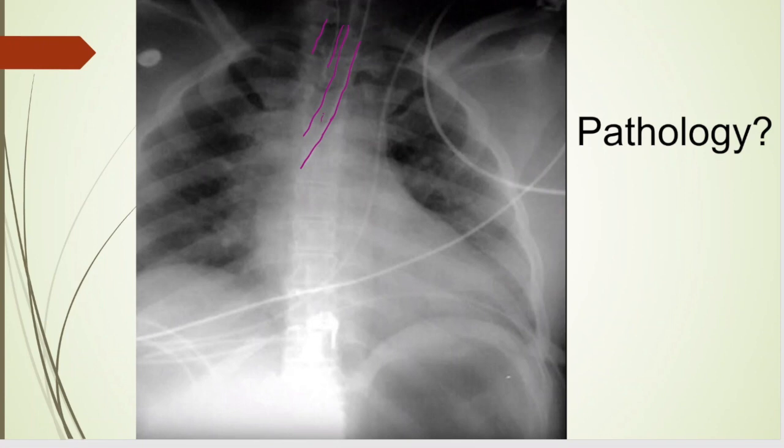So the FBI would call that a clue. Keep that in mind. B for bones. Okay, we looked at the bones. Not much going on. C for cardiac silhouette. Wow, looks like a big silhouette here. D for diaphragms. Here's your right diaphragm. Here's your left. Look at this air. Holy moly. This stomach is full of air.